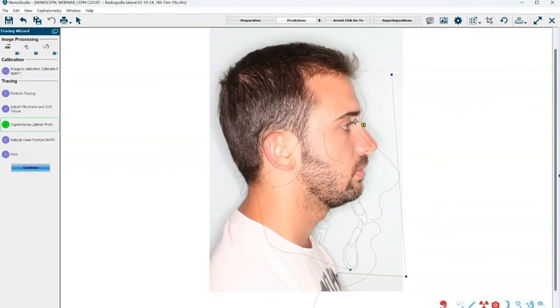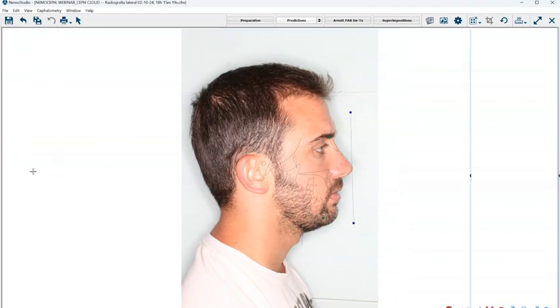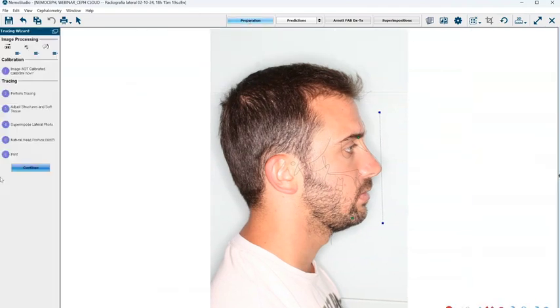Okay, let's select from these 2 points. Okay, let's make it as accurate as possible. Let's go. Preparation.